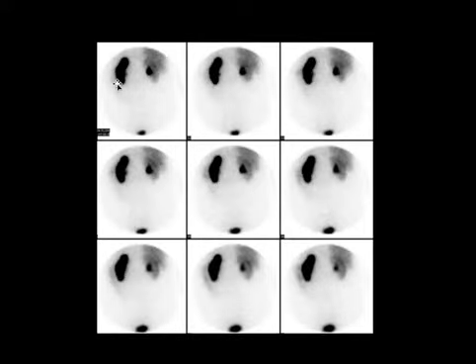Here, in response to Lasix, it concentrates the tracer, but there is again no excretion. So here we are looking at findings consistent with slightly more chronic left-sided UPJ obstruction.